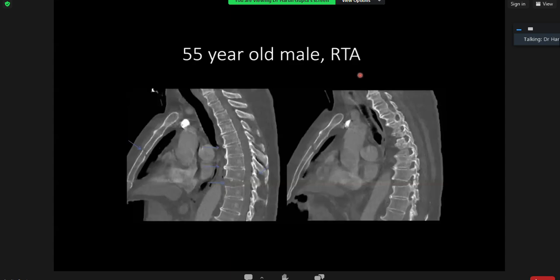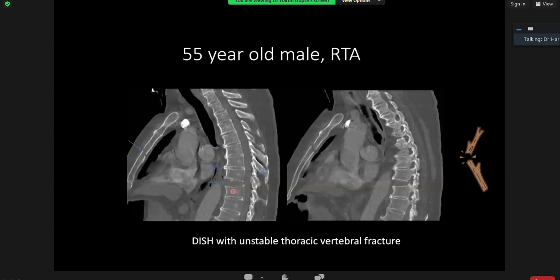And this is another thing we see all the time, which is called rigid spine or fused spine fracture. The patient has a sternal fracture. There is a complete stick type fracture across the fused spine. These are very unstable fractures. They often lead to cord injury, epidural hematomas, and they will almost always need repair. It's a stick fracture because once this is fused, it behaves like a long bone. Like long bones break like that, the spine also breaks like that. Sometimes the fracture may occur through the middle of the vertebral body, breaking like a bone.